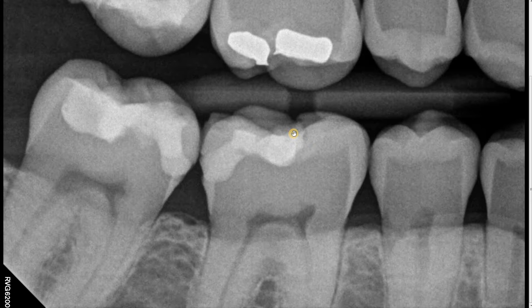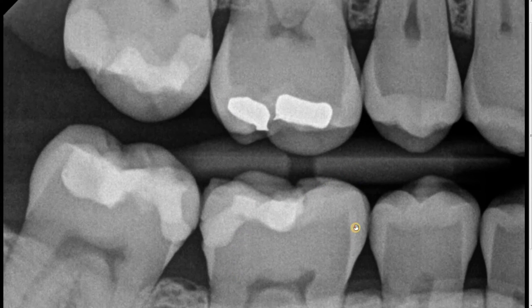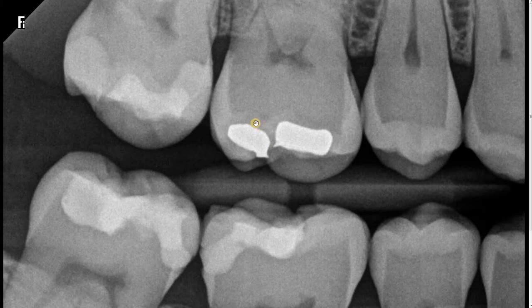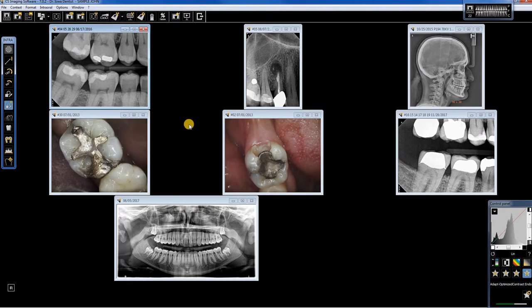You can see the hand there in the center of the screen where the yellow dot is. If we left click and hold, we can actually drag that screen around so we can view more of the screen. In order to get back, we will double click once more. All right, so there's this minimize button here, restore down. If we click on that, that'll bring us back to this screen again.